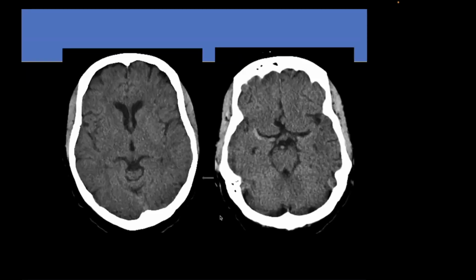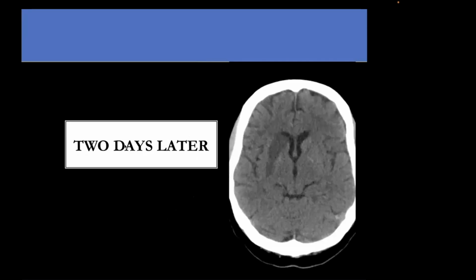This case that I showed you actually in the quiz here, just showing you an acute infarct, dense MCA, blurring of the basal ganglia. Here's that same patient 2 days later. Now you can see the low attenuation in the lentiform nucleus and the low attenuation in the caudate head in this patient with a distal ICA occlusion. Contrast that with the caudate head on the other side.